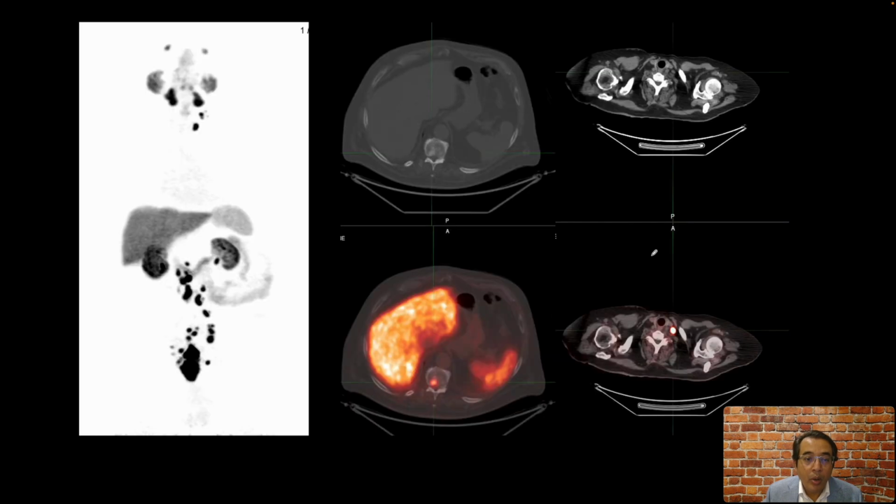This patient also underwent a PSMA PET-CT, and here's the rotating image from that PSMA PET-CT showing a supraclavicular node uptake, the Virchow's node. Then we see uptake in retroperitoneal lymphadenopathy, pelvic lymphadenopathy, and here is that focus that we see in a vertebral body corresponding to a sclerotic lesion, and this is the same focus that we saw earlier on the whole body bone scan.